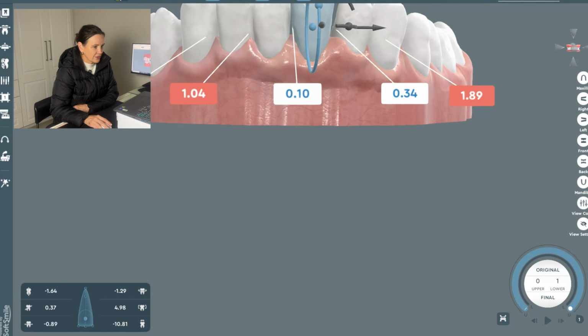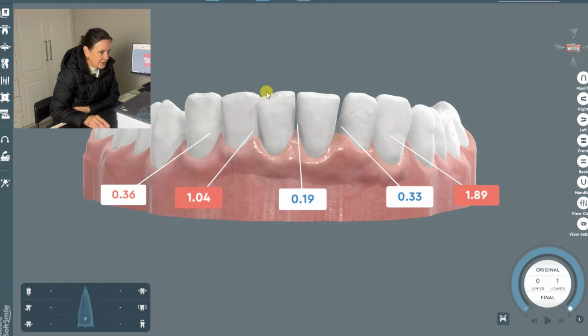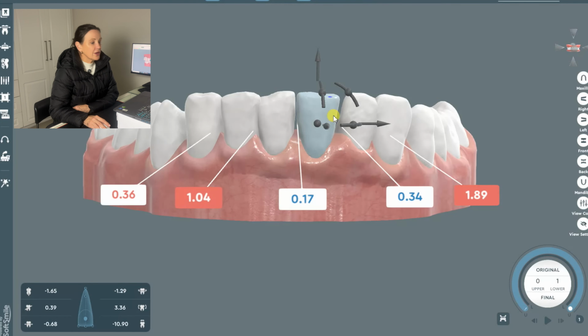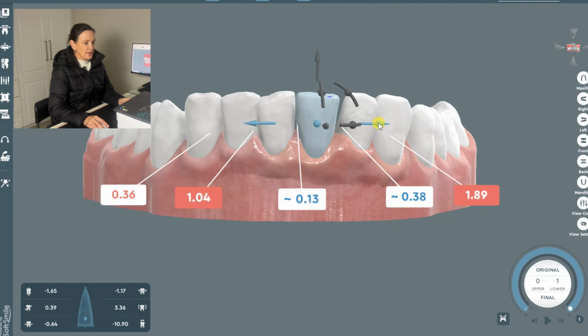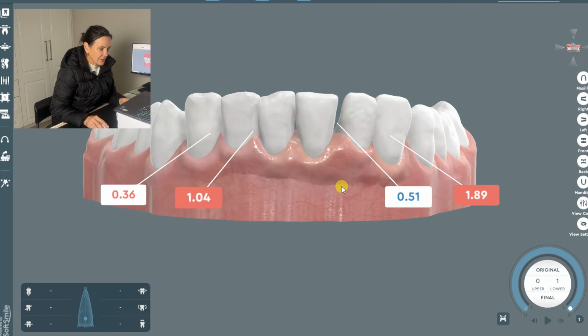So let's just go back there. No, I don't like that. That triangle bugs me. Just close that space up there. That's maybe not... Now, I'm doing detail. It shouldn't be done now. Let's just carry on to see how we're going to address the space problem here.